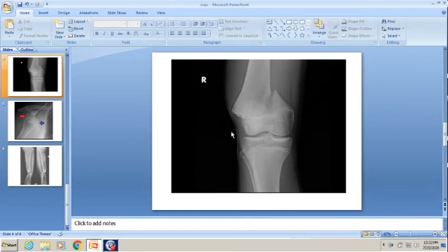So now, the epiphysis, you can see a shadow here. So that is not fused. Now I think I have given you a hint. So there is a fracture through the epiphysis. So what special type of fracture do you say when there is a fracture through the epiphysis? You call it an epiphyseal fracture.